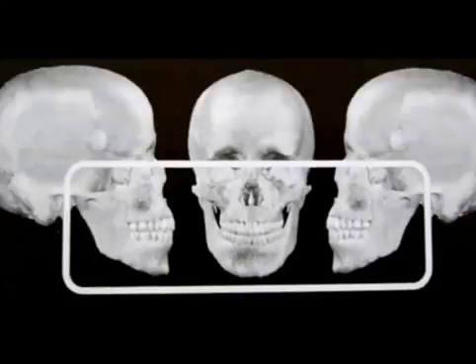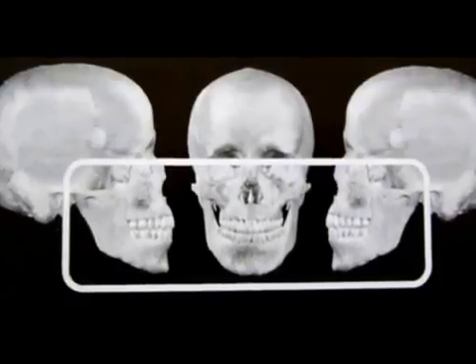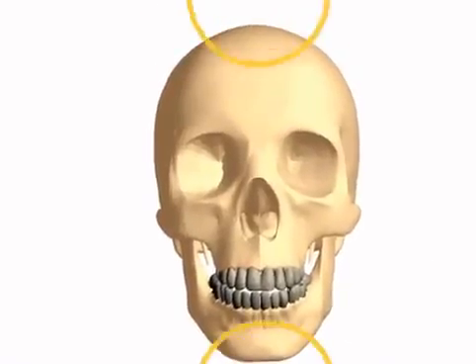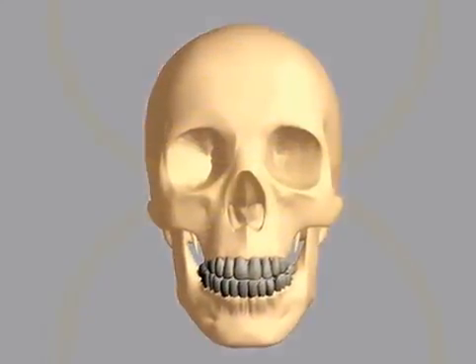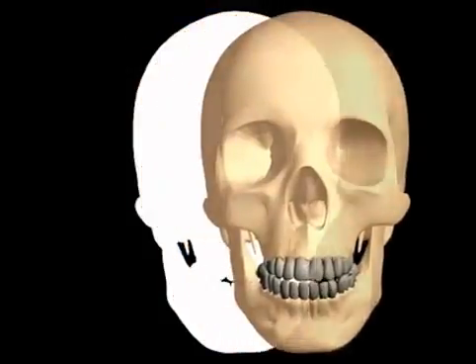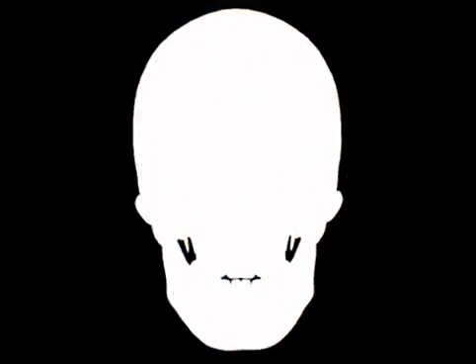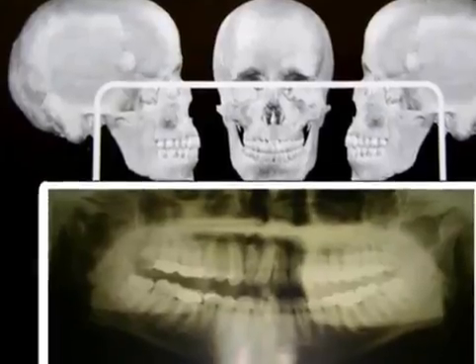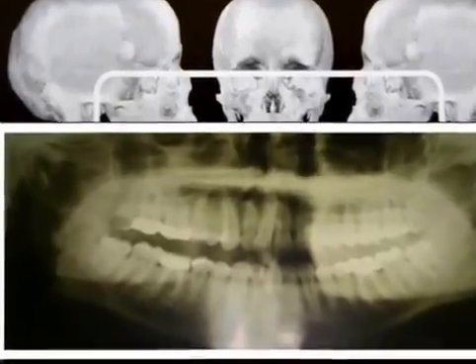A panorama picture provides a doctor with a good overview of the condition of your facial bones. A simple rule of thumb is that wherever X-rays go through easily, a picture turns black, and wherever they are stopped, the picture shows bright spots. First, we will look at some normal panorama pictures, and you will soon be able to recognize your own face.